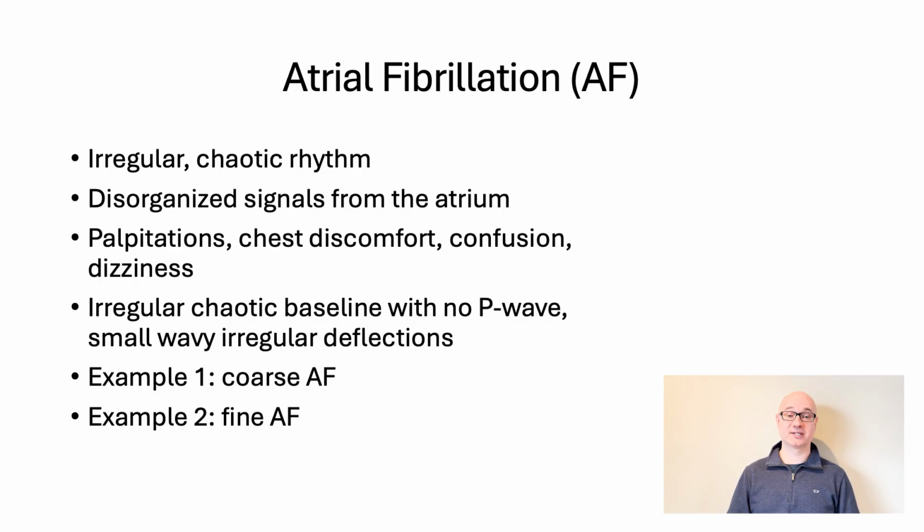And what this means is that you have differentially spaced QRS waves, and based on the last two QRSs, you're not going to know how far the next QRS is. And so this unpredictability of irregular waves is why it's called irregularly irregular.